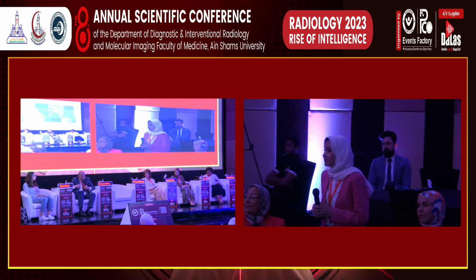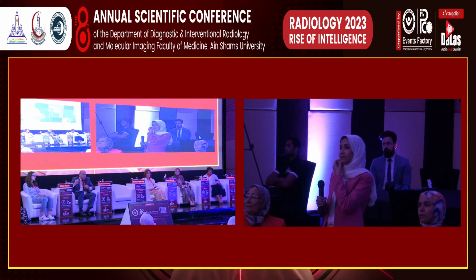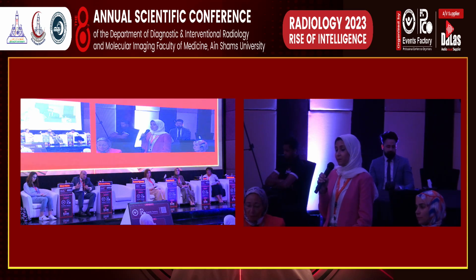في البيت سي تي. اللوبلر كارسينوما في البيت سي تي. البيت سي تي اي ثينك ان هو في بيت فولز عنده، يعني بكملت بقى النقط كلها. اللوبلر كارسينوما دايما بتبقى فيه لو اف دي جي ابتيك، واحنا دايما بيبقى تريكي جدا البيت سي تي في الكومنت بتاعه انه ما عندناش اكتيفيتي عاليه، فاحنا دايما بنريلي للمورفولوجيكال نوت ميتابوليكالي في اللوبلر سب تايب اوف بريست كانسر. ما هي they are always low FDG uptake.